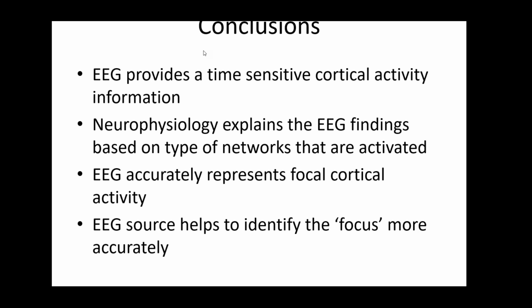It's particularly helpful when you have, let's say, temporal spikes that move to the frontal area, or one area of the frontal lobe that moves to the contralateral frontal area. So this directionality and direction of the propagation of the dipole is very useful to understand the epileptic network.